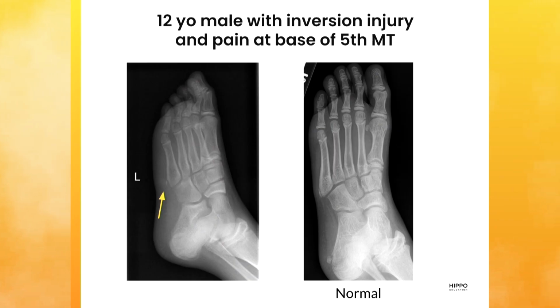So when I take a look at this, the apophysis looks a little more immature than the one in the normal, but I still think it looks like an apophysis to me. Yeah. Now, I hear people talk about like, it's well corticated and adjectives like that.